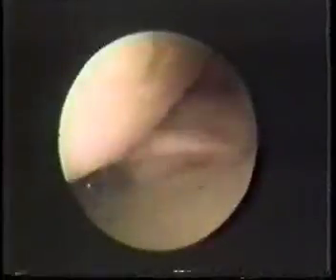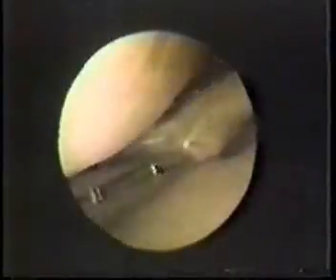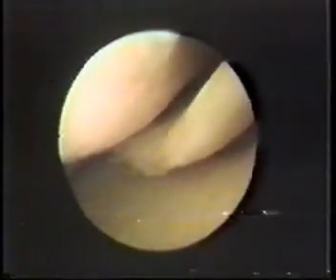It's actually quite, see that thing? That whole big tag was connected to the meniscus by just a very small little peninsula, and it was free in the breeze, so to speak. And that tag right there is this abnormal piece of meniscus that is subluxing into the notch here. That's the appearance, that's the MR appearance.